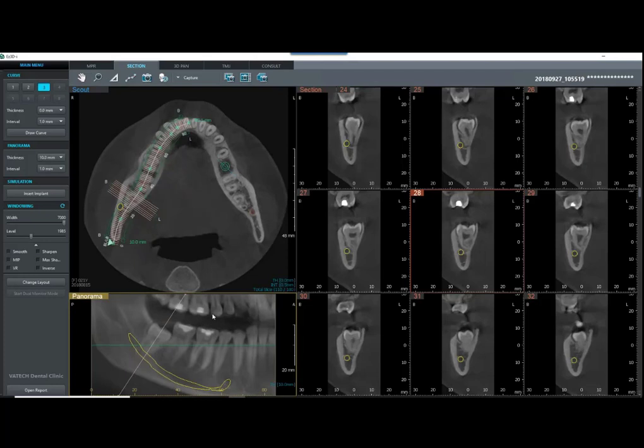Now we looked at our molar here, and I would like to look at one more way, or a couple more ways, to draw the curve. So we've been drawing around the arch going clockwise. Let's look at this molar in a different view. So I'm going to go draw a canal. I'm going to go here, starting out buccal, and go across lingual, and double click here.